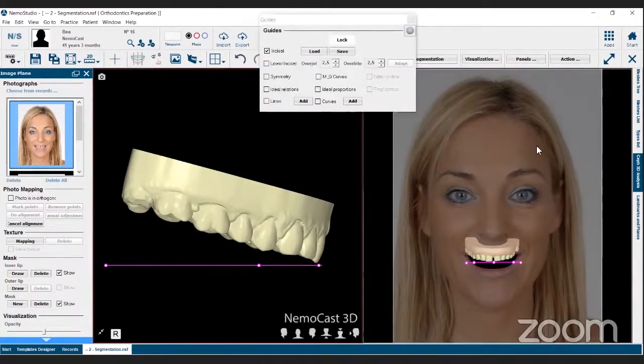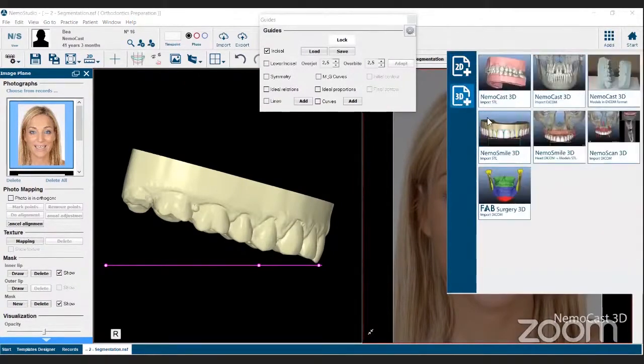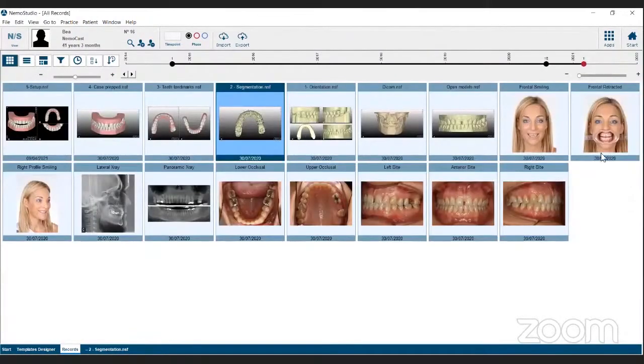What I was mentioning after showing the web page is that over here in apps, we have the different apps for each one of the clinical specialties that each doctor practices. And all this software is multidisciplinary. So I started here with a case that I already have.